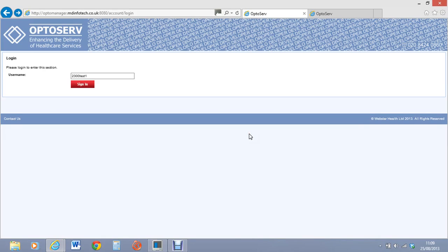Right, hello everybody, this is just a quick video to show you how to use the webstar Optoserve software for inputting your IOP repeat measurements. It's pretty self-explanatory software, but for those that are either a little bit computer illiterate or struggle a little bit with it, this is just a helpful video to help you get through.